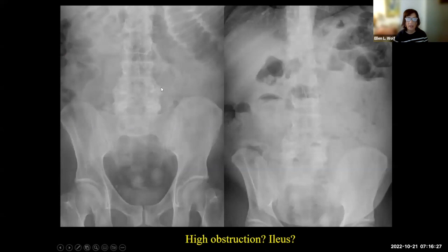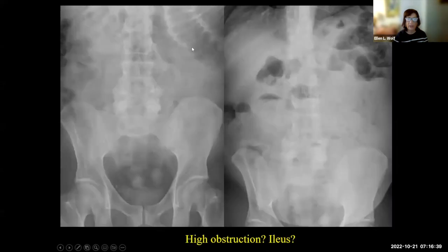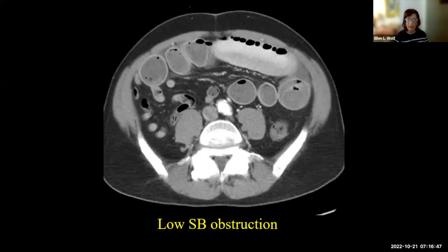And another patient, they had these dilated loops of small bowel. It was unclear whether this is obstruction or ileus. This is their upright view and their supine view. It turned out they had a low small bowel obstruction. So in this case, even if you diagnosed small bowel obstruction or considered it, you would think it was probably a high obstruction. However, this was a low small bowel obstruction. The transition point was very distal in the ileum. So we're not accurate in diagnosing the level of obstruction on plain films as well.